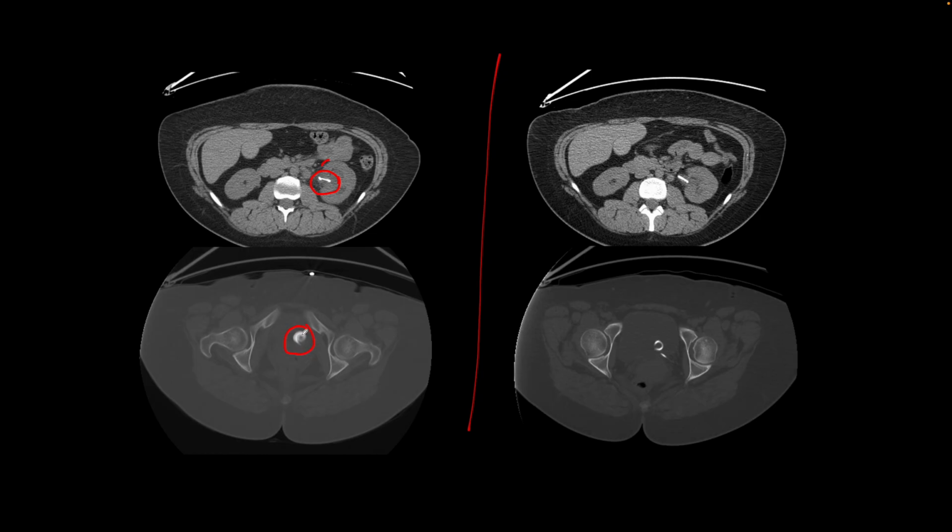The distal end of the pigtail is where there are holes for the urine to come out into the bladder, and when concretions develop, those holes are blocked and the catheter malfunctions or is not functional anymore, and so there will be upstream hydronephrosis that we see here. And so compare it to the prior scan when the catheter was placed, the proximal end looks okay, there is no hydronephrosis, and the distal end looks okay also.